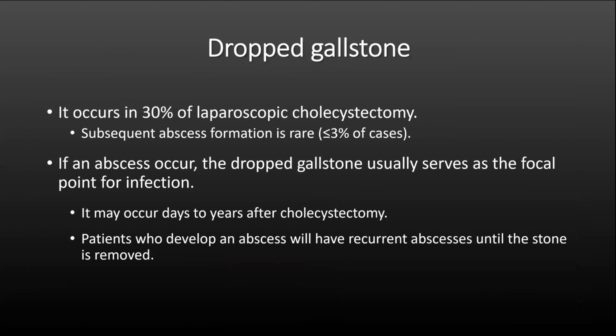The awareness of dropped gallstones is important because it may mimic other conditions such as peritoneal metastatic disease, or in our case, it was query GIST. The dropped gallstone occurs in 30% of laparoscopic cholecystectomy. Only 3% of the dropped gallstones may subsequently develop an abscess.